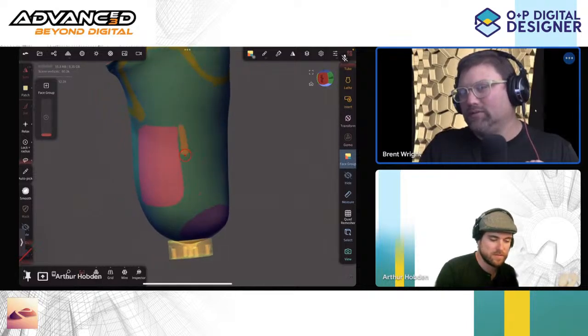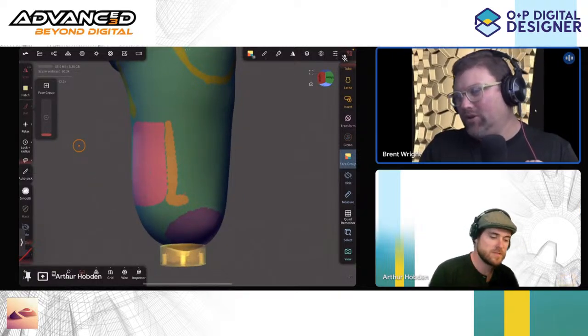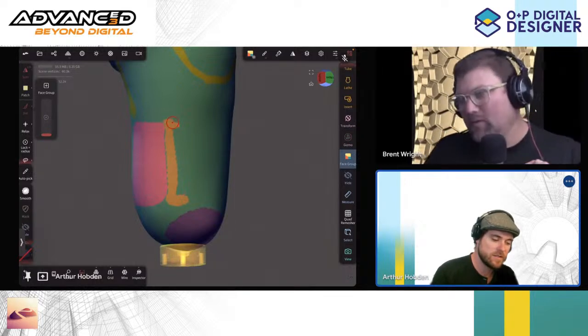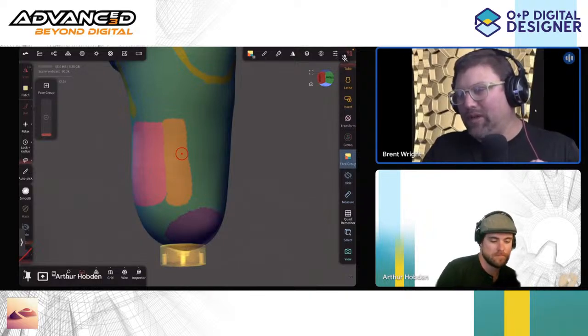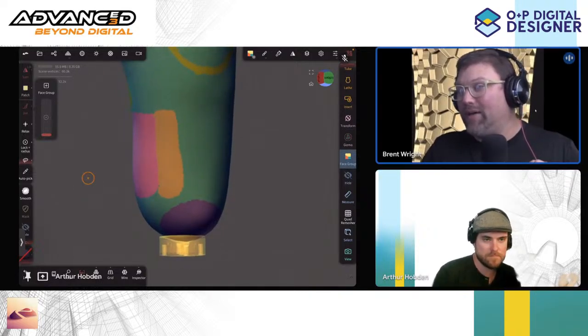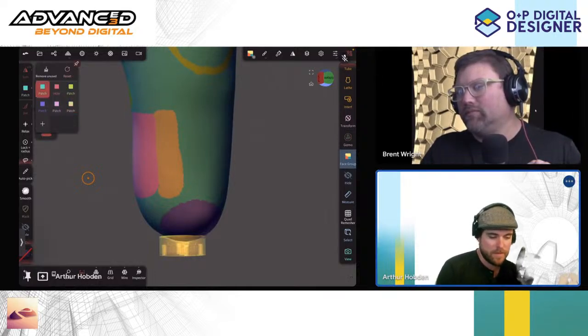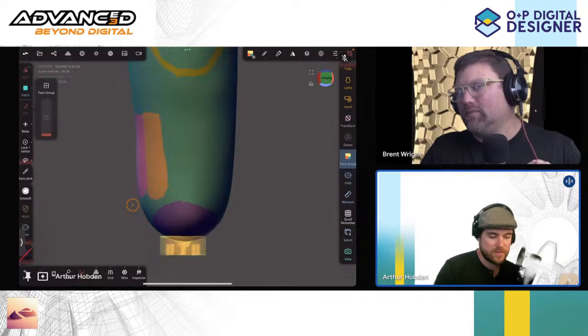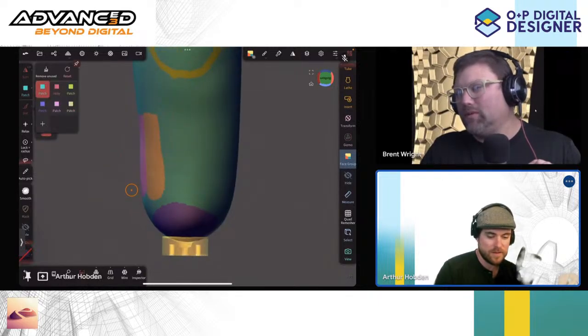Okay. That's like if you reach down to your shin bone and you feel the flat side on the bottom of it. That's what you're trying to load now. Right where the orange collides with the pink is where the edge of that bone is. Gotcha. Good to know. And then you were saying something similar on the other side. Yep, same thing, two colors.